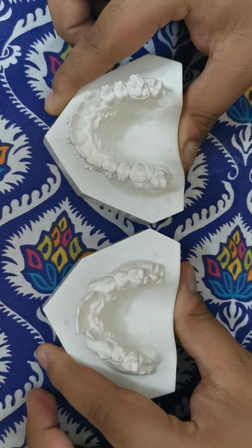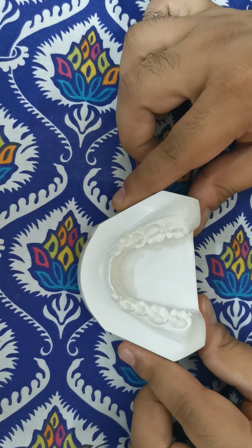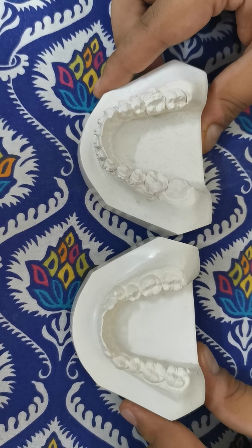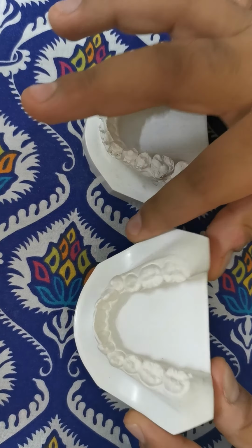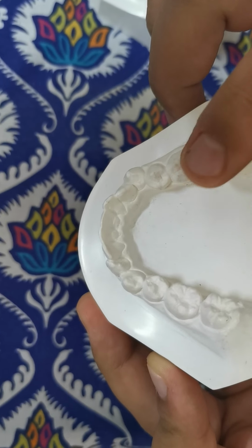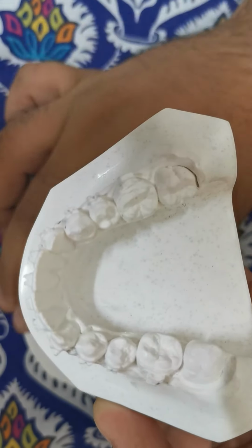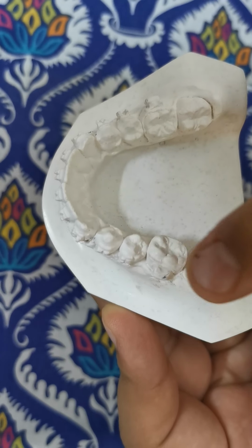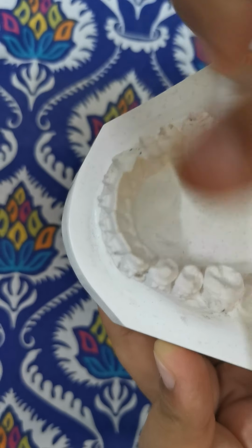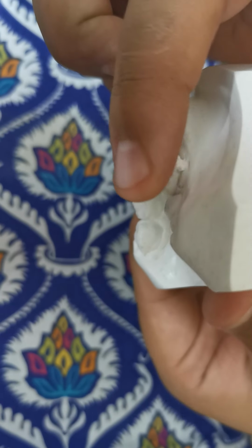All right, now I'm going to show you the mandible cast. This is the before ortho treatment mandibular cast, and now this is after orthodontics. As there were very minor problems in the lower arch, mild crowding and mild rotations were present. So we have aligned the lower arch. As you can see here, look at the curve, look at the arch, a symmetric arch. We have relieved some of the crowding and some of the rotations. This is very beautifully aligned, still in the process. And even the curve of Spee is slightly addressed.